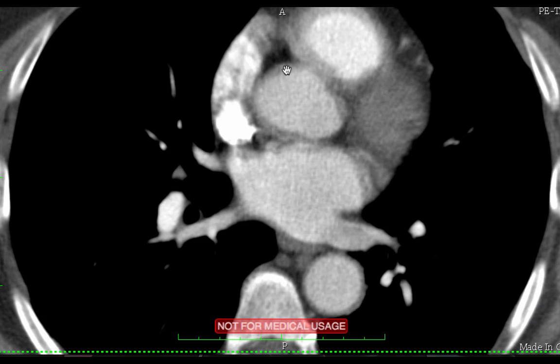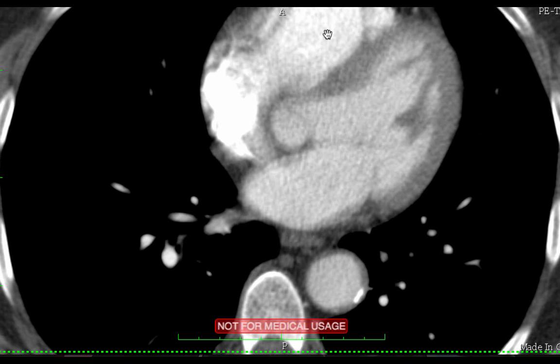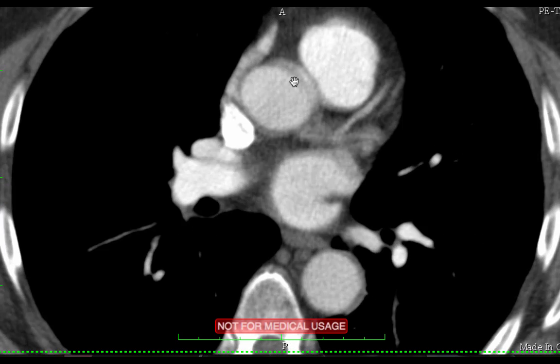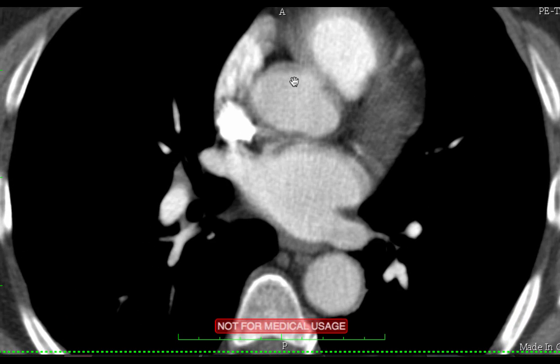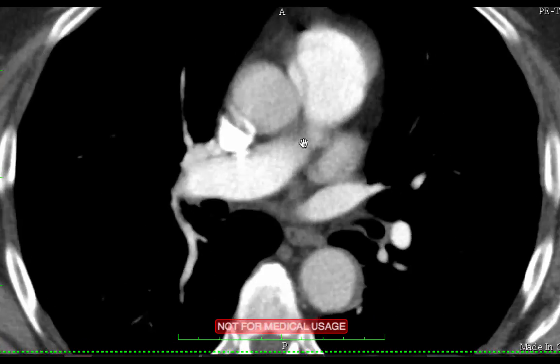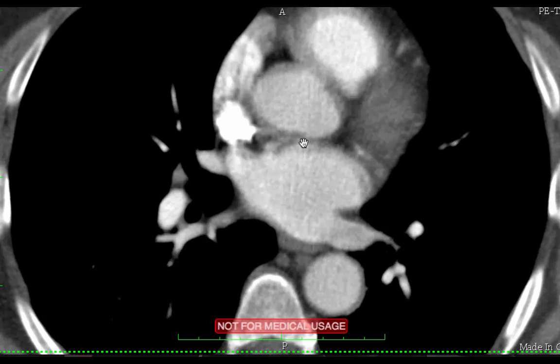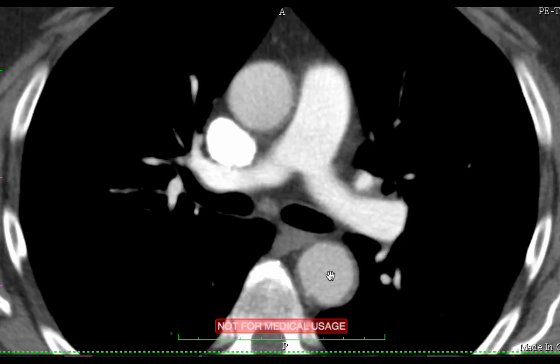So when you see those structures next to one another, and here you see an even more extreme relationship, this is at about the 1 o'clock position, the pulmonary outflow tract in relation to the aorta. Okay, so you get the idea. I think it's a helpful thing to keep in mind, because then when you go up and down and up and down, it makes some logical sense why it's doing that. Okay, so here's the aortic arch. That makes this ascending aorta, descending aorta.